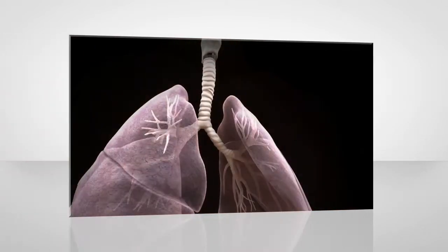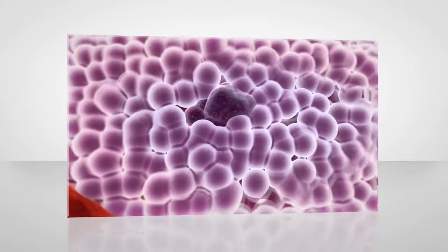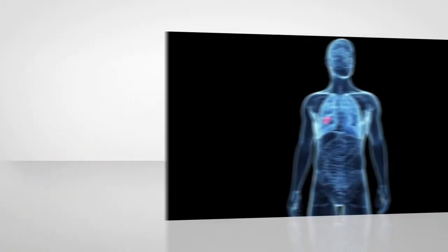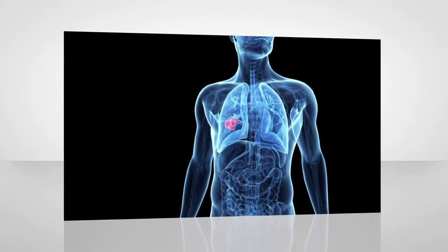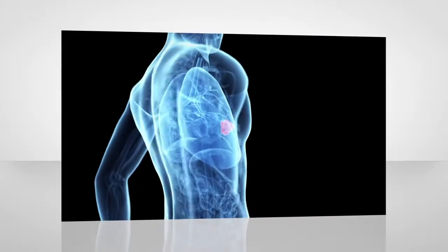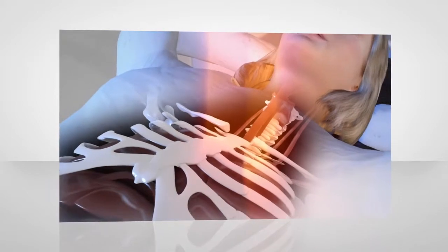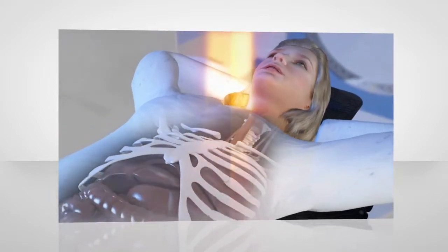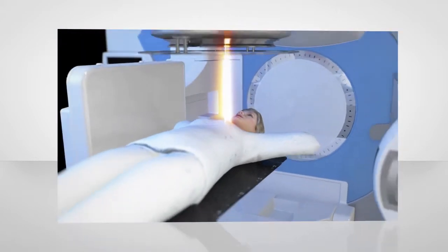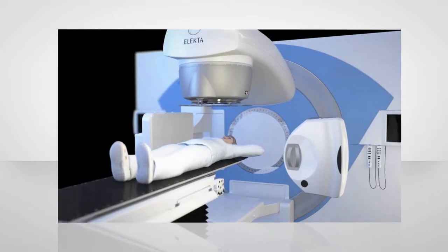Lung cancer is the most commonly occurring cancer in the world, and it requires special consideration while developing the radiation therapy treatment plan. Lung tumors can move during breathing, and their location is often close to many sensitive tissues and vital organs. Many lung cancer patients receive external beam radiation therapy at some time during their treatment, and more patients with early-stage inoperable lung tumors are prescribed a stereotactic approach because of its high levels of accuracy.